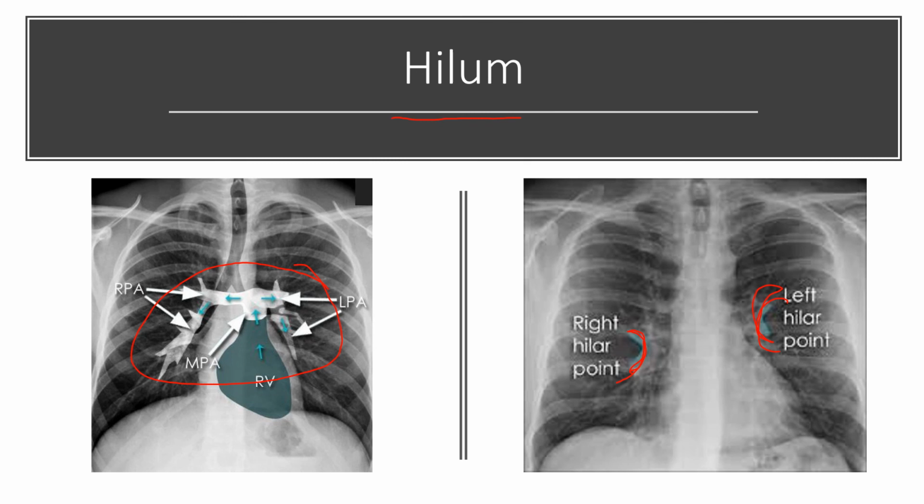There's a lot of things that can cause hilar infiltration, and you'll have a lot of your patients that have hilar infiltration because a lot of your patients will have pneumonia, and pneumonia can cause hilar infiltration, because the hilar infiltration is usually caused by a lot of lymphatic vessels being overloaded. And that's what you're traditionally looking at there when you're doing this. So that's something just to pay attention to.